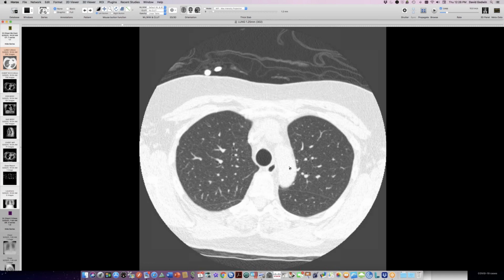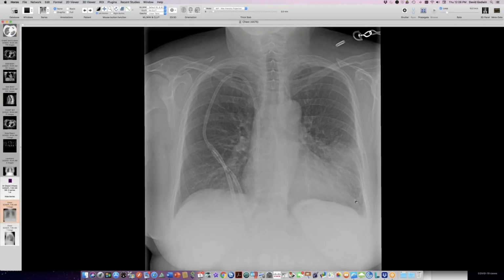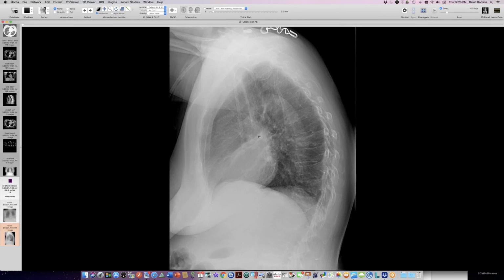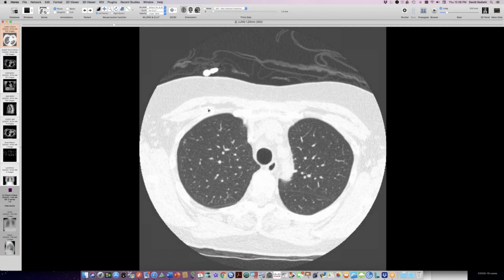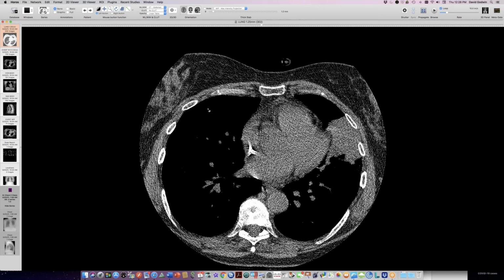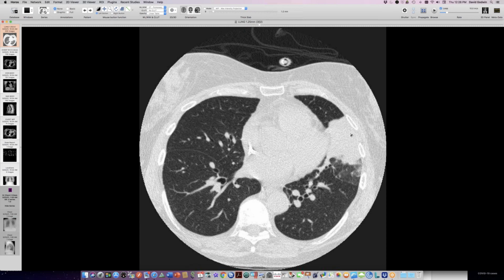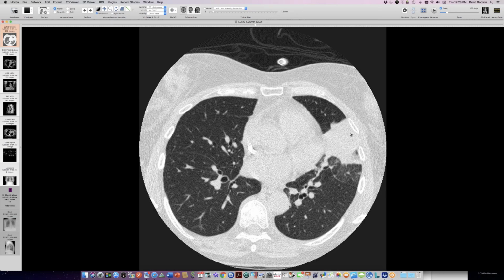Okay. Yeah. So let me show you a different person now. This is a woman who was getting chemotherapy for myeloma and developed this blob in her lung. She's neutropenic, and you can see she does have this consolidation here on the lateral view, and you can see here on CT it's fairly compact consolidation. So when I see compact, I think of fungus, but it's not really forming a nodule. But if you told me that they got mucor out of this, I would say that's just fine.